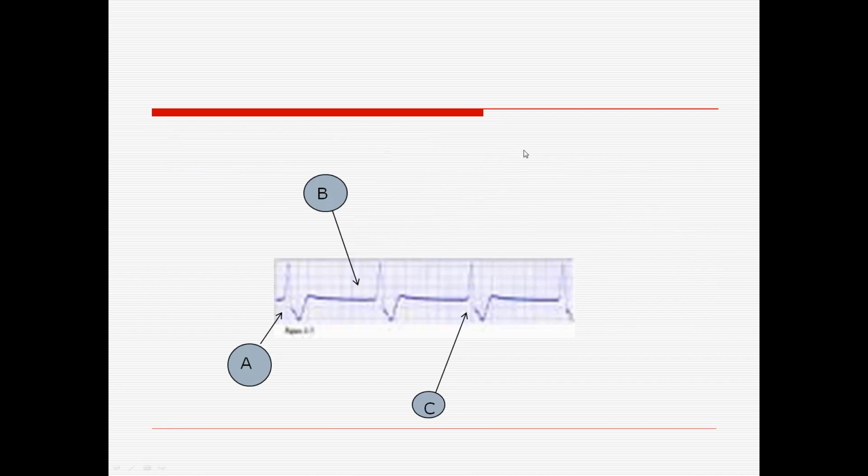Now, I also said that you can have narrow or wide QRSs. Here's an example of a very wide QRS. Notice it's not together, it's wide. It's got this great big, here's your R, and it goes way down here. These are wide QRSs. Those are not normal. Although the heart can do that, because if there's a blockage and I have initiated an electrical impulse in my ventricle somewhere, this is what it would look like.